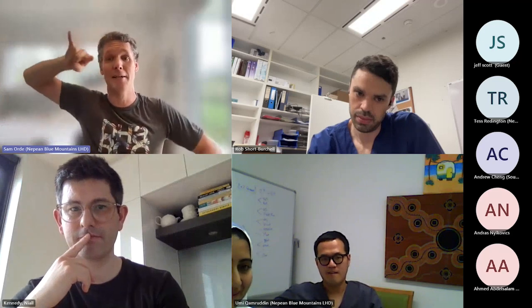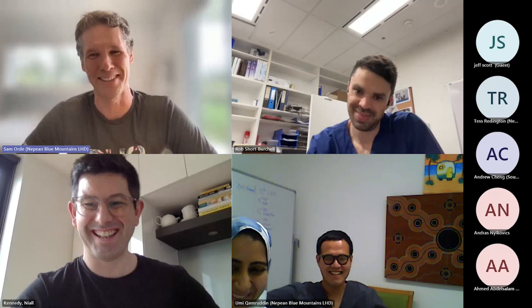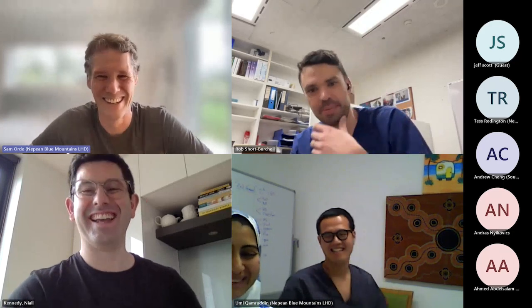If you do a spontaneous breathing trial and you see their diastolic function flip round when you take away the positive pressure ventilation, these are guys who are going to get weaning-induced pulmonary edema, and that's what next week I'll show you all those examples. So yeah, that's a much better example I should have used rather than trying to keep a patient out of ICU. Forgive me.